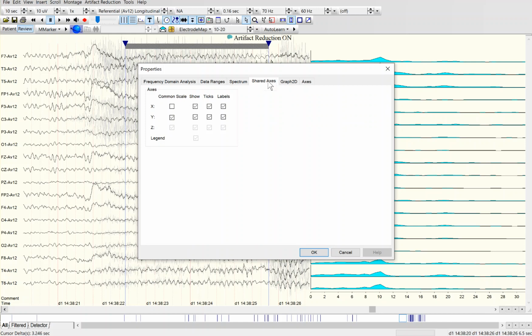First, it's going to look at the FFT power so that I can pick a peak to do the analysis on. Next, it's going to show the phase relationships from 0 to 20 hertz, because I set that in my spectrum. I'm going to show the phase relationships of that, because it may have more or less correlation at a particular frequency or coherence, but there's a phase relationship there as well. So if it's 180 degrees out, it may be a dipole, right? That's oriented in a way that you have the phase 180 degrees or negative 180 degrees out. If it's closer to 90, it's a bit ambiguous. If it's much less than that, it's usually propagation delay.